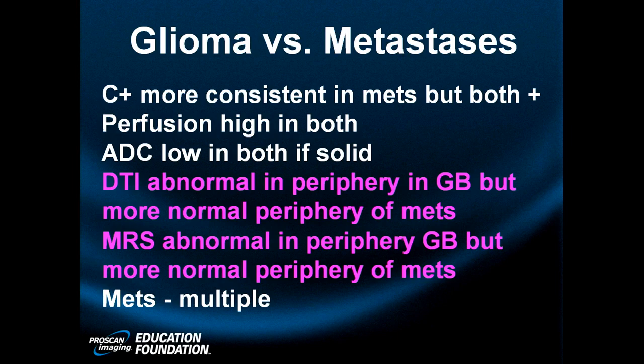We're talking injection, 3 to 5 minute T1, 50% will not enhance, or enhance scantily. But in metastases, the enhancement is 98% of the time. So enhancement of a lesion where you're having trouble deciding between the two for morphologic reasons favors a metastasis. If there's no enhancement, it virtually excludes metastasis.